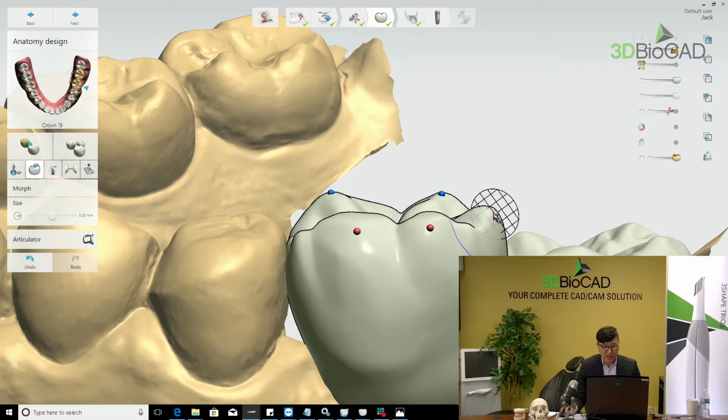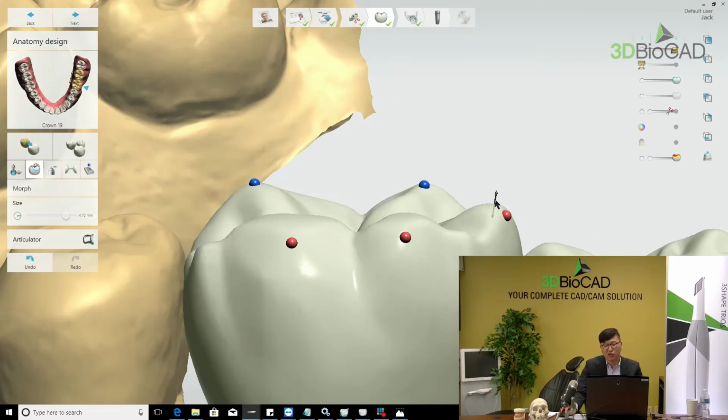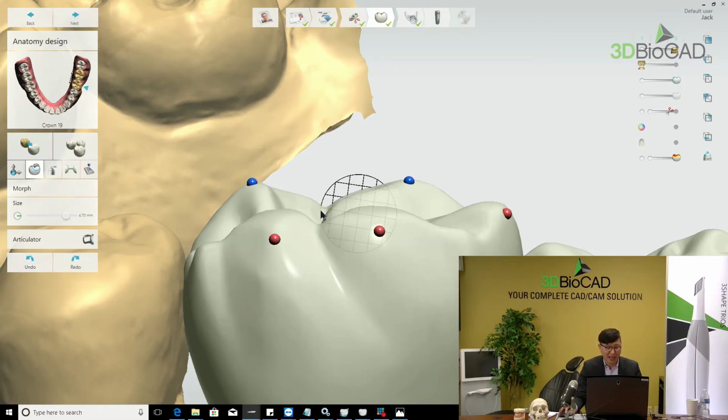I'm just using control. Can you see that small arrow here? If you push and hold control, your morphing tool is always set to this direction. Without the control button, of course we can just grab this and carefully move, but if you make a mistake, like oops, please click undo. Or if you're really bored today, do the dance like that. I like this. Okay.